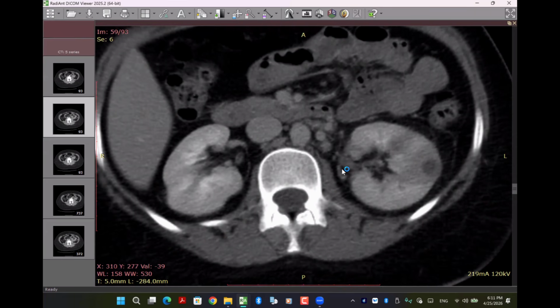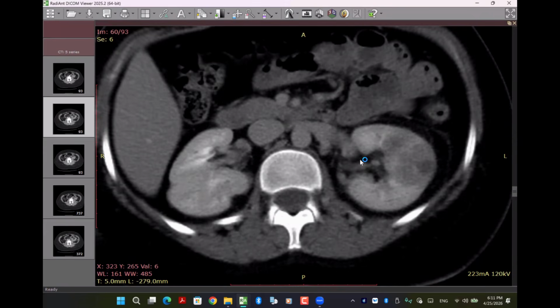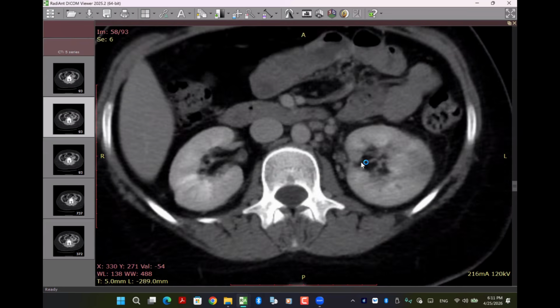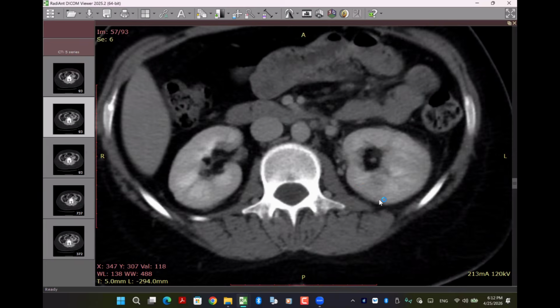Of course, the other differentials are excellent, but first you want to ask about the fever. Exactly. If there is any cardiac disease, I might suspect that this could be infarction, but this is not infarction, as there are changes in the perinephric fat planes. Yes. You got my point?